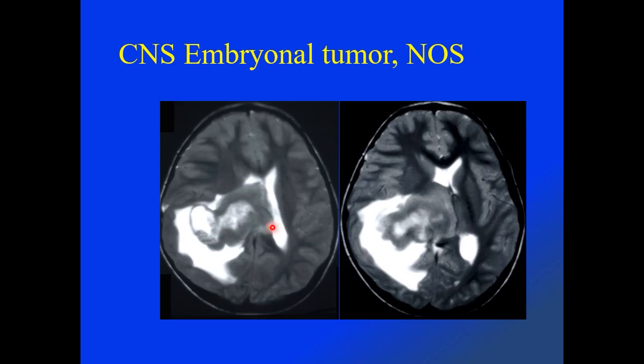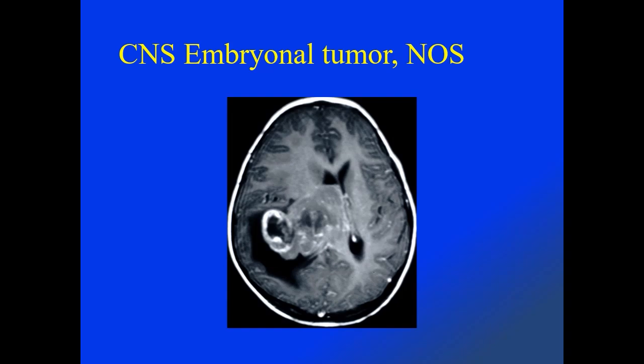Different patient with more complex signal intensity mass with areas of isointensity peripherally, hyperintensity more centrally, with a cystic component and associated edema involving the right posterior cerebral hemisphere, proven to represent an embryonal tumor. The mass demonstrates irregular heterogeneous enhancement pattern.